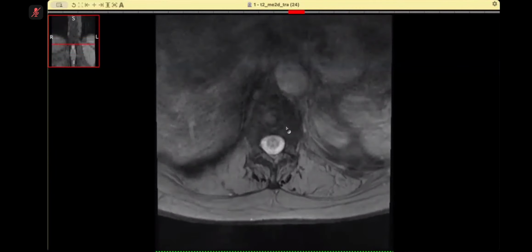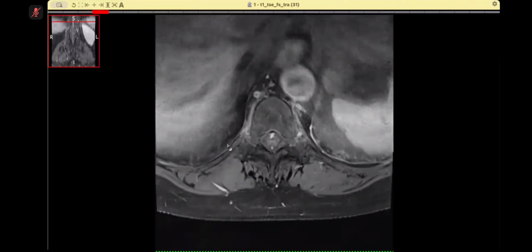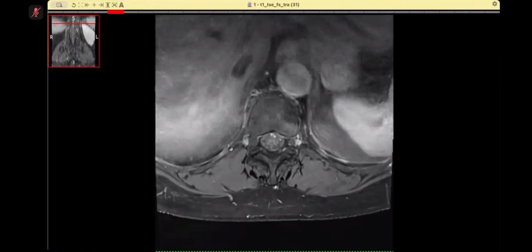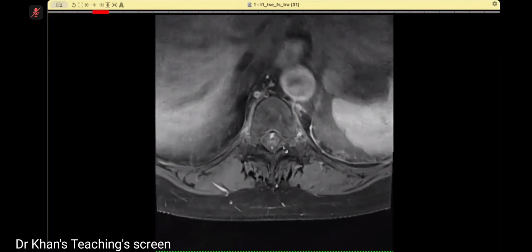And of course, it all depends on the examiner and the scenario. If they want to show you a T2, they can. Just like the candidate asked, that was a very good call to ask for post contrast, and you can see these serpentine vessels. And on axial, I can actually, just to check you, show you the axial instead of the sagittal.